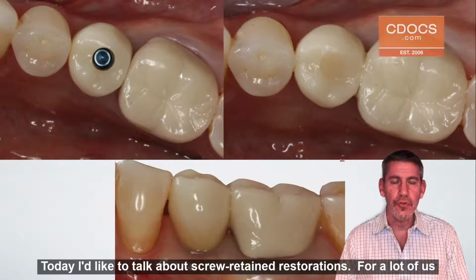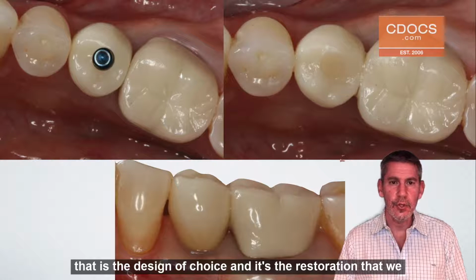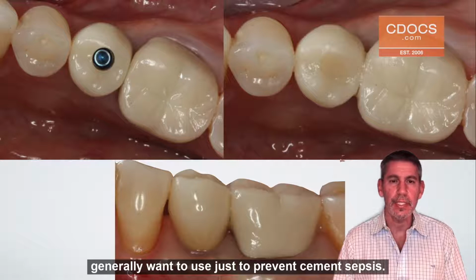Today I'd like to talk about screw-retained restorations. For a lot of us, that is the design of choice, and it's the restoration that we generally want to use just to prevent cement sepsis.